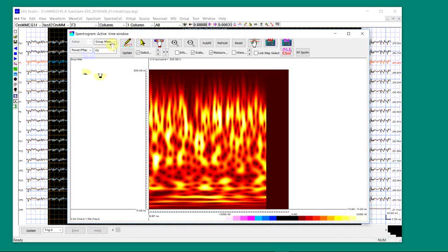In the spectrum here, we show the electrodes. For example, we can see each electrode. Here means either power or real data or imaginary data to show the spectral power. And this is the scale bar, the color bar. That's how it encodes the spectral power.